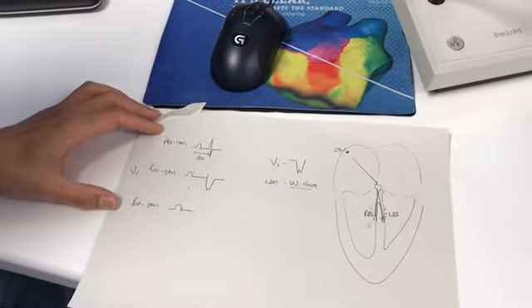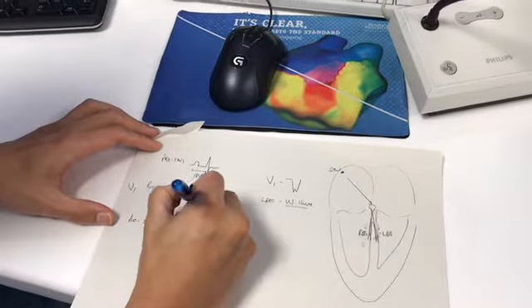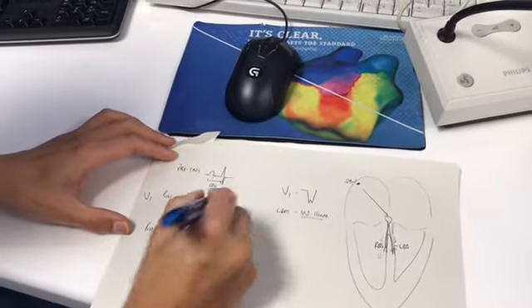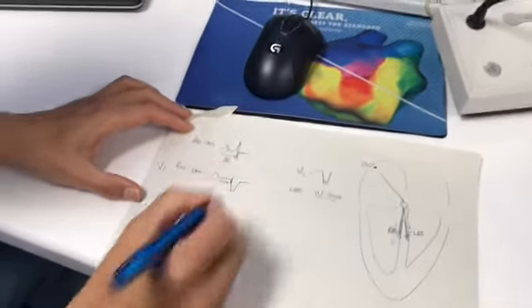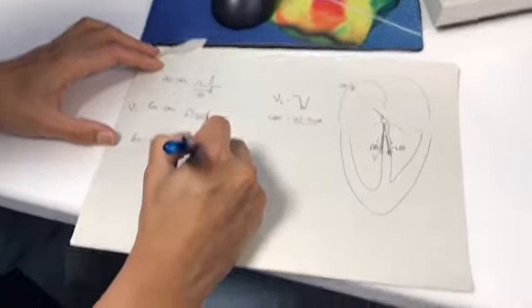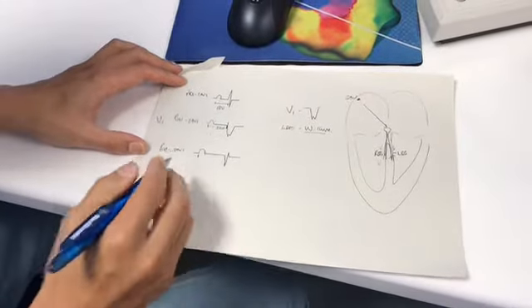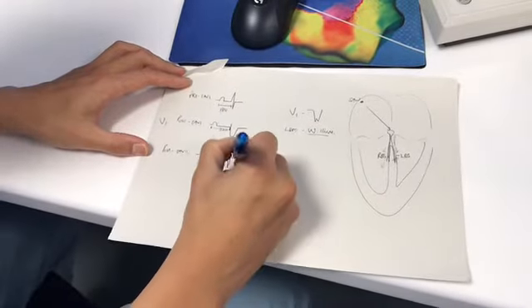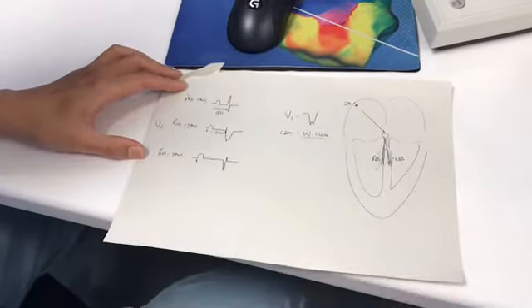Now the thing is with TAVI, we sometimes see this phenomenon where, for example, if this interval is 220 from the onset of P to the left bundle QRS complex, the complex sometimes starts to narrow again. Does this generally mean that life is getting better, the conducting system is improving?